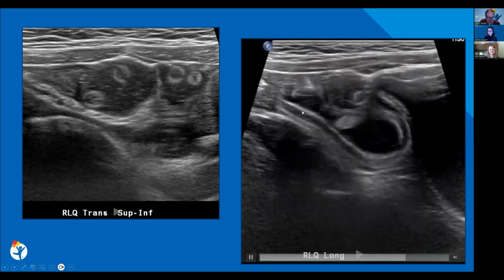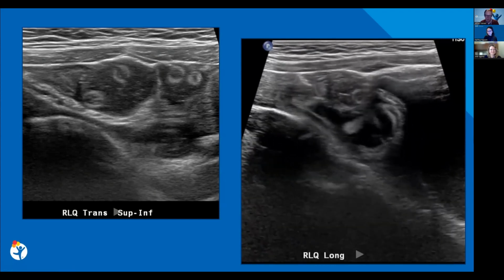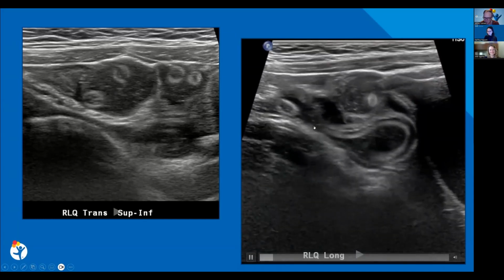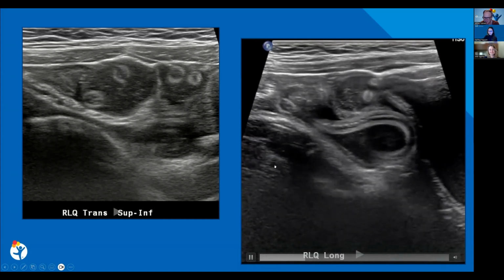So this patient ended up having a diagnosis of ascariasis. These intraluminal worms, this is not something we super commonly see in Colorado anyways. So this was an interesting case, not necessarily a specific learning point for this one, but just keep in mind this is something you could potentially see.